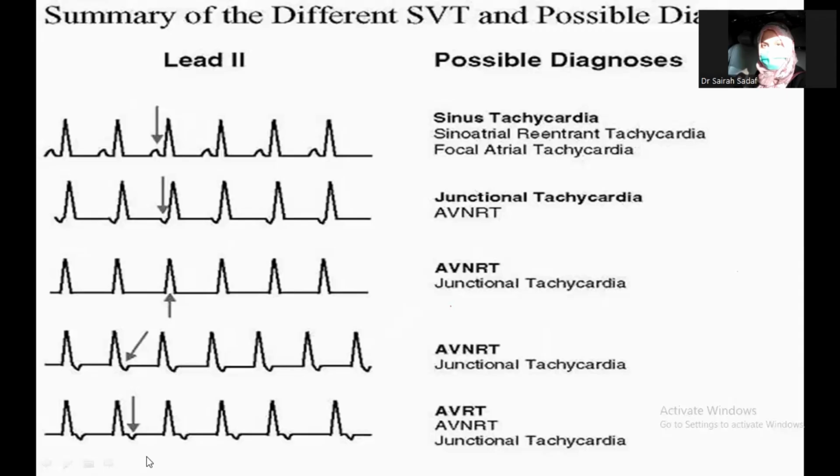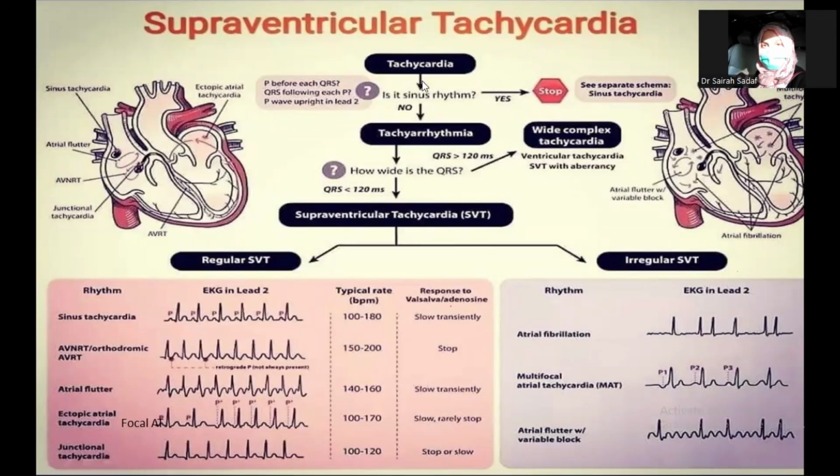Merging in the ST segment. So it may be AVRT, AVNRT, junctional tachycardia. Starting from here, then you're having a tachycardia on ECG tracings or on the cardiac monitor.